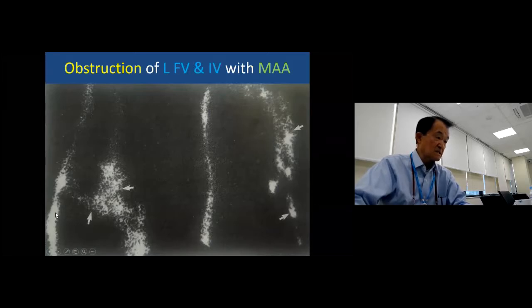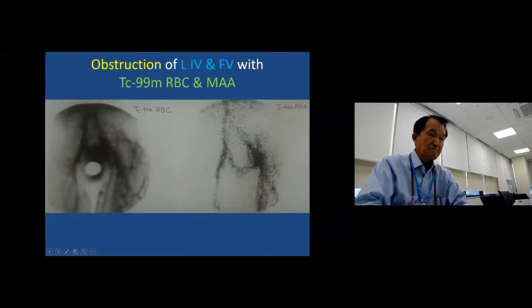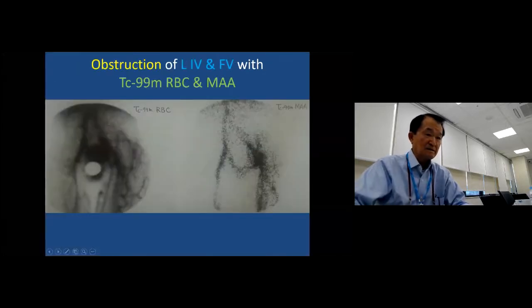Obviously, here is the right side femoral, iliac, and inferior vena cava. Left side, lots of activity here, crossing the pelvis. So there's a blockage here, here, here. All these are collaterals. And this femoral has all collaterals here, the popliteal. Here again are collaterals, and the obstruction is here. So once you have obstruction down here, you can have obstruction in many proximal portions.